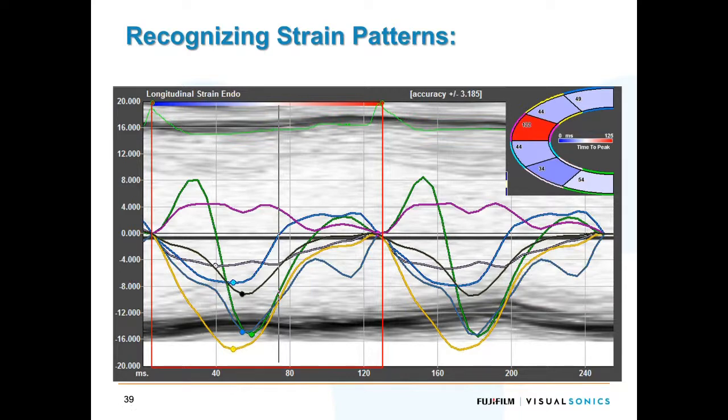So to approach understanding your MI and the compensatory contraction, you would look at your peak strain values here. So your blue and green, these are going to probably have a higher percentage than something that's closer to your infarct. So you can compare the peak strain in each segment to each other to see what the velocity is of that segment.